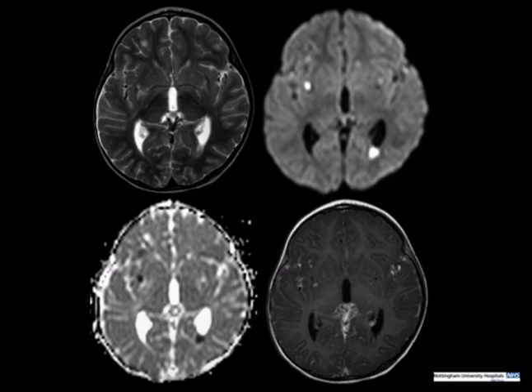The next thing I wanted to show you on this case is how useful diffusion-weighted imaging can be, in addition to infarction, to show you complications. So here you've got a layer of diffusion-restricting material in the left occipital horn. It doesn't really enhance very much, but there is definite diffusion restriction on the ADC map. So this is ventriculitis, or pus in the ventricles.